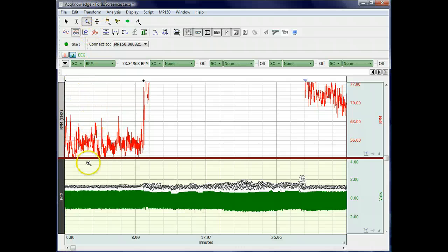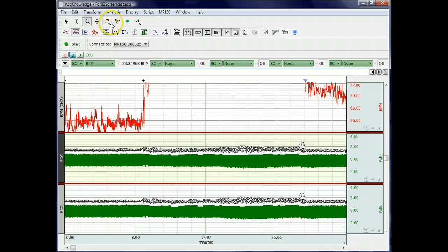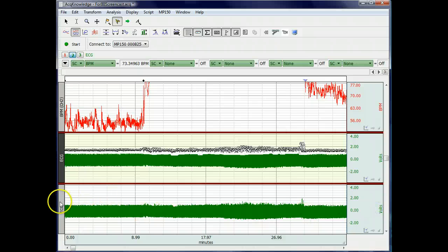Okay, one last thing, just to show that sometimes you can really think outside the box. I'm going to duplicate this channel. Get rid of all the events in our duplicate.